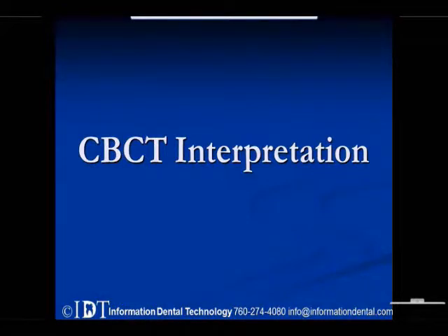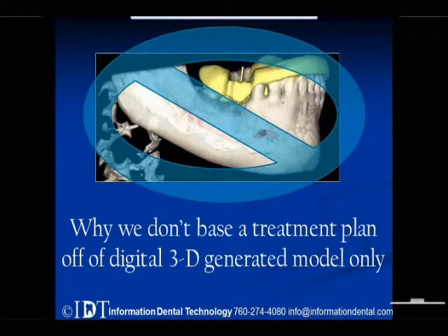So we'll get into the CBCT interpretation. Over the years I've worked with a lot of different software programs, and I've seen this happen a lot, where I come in and we're looking at a case, and I see doctors treatment planning only off of the 3D model, which really makes sense. The 3D model is intuitive.